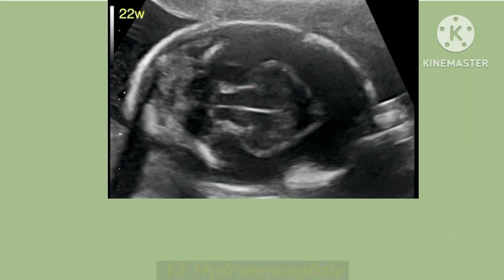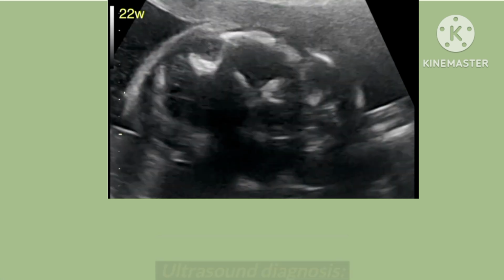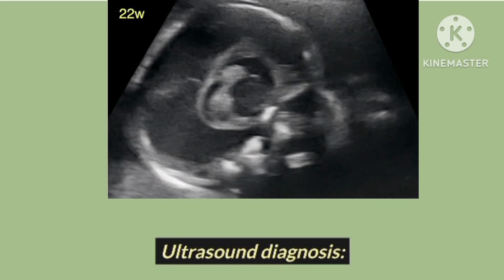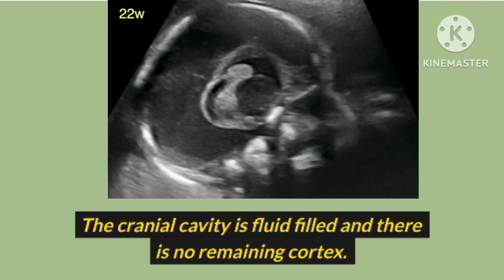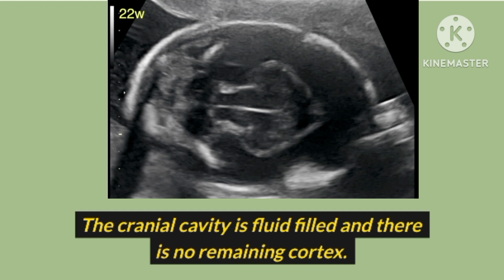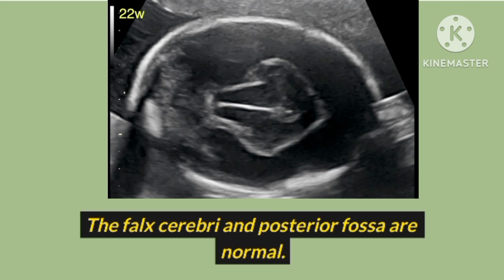Number 13. Hydranencephaly. Ultrasound diagnosis. The cranial cavity is fluid-filled and there is no remaining cortex. The falx cerebri and posterior fossa are normal.